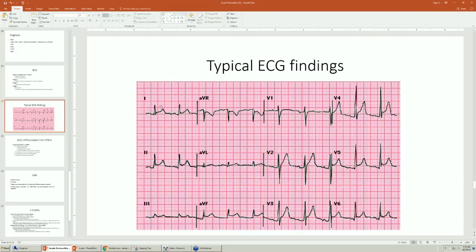You see ST segment elevation in lead 1, some over here in aVL. Hey, this is pericarditis. Even the most preposterous confabulation of anatomy in the LAD is not going to produce this kind of EKG. So even if you're going down, saying okay, anterior, septal, well maybe a little bit lateral, and then inferior wall, because the LAD supplies a third of the inferior wall, where the PDA from the right supplies two thirds, and you say, okay, I've got that. And then you say, oh no, that can't be. So then it's pericarditis.